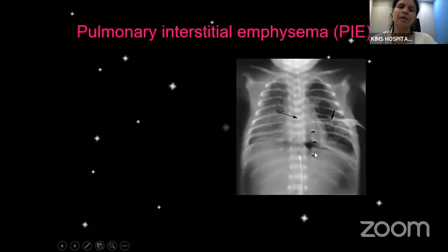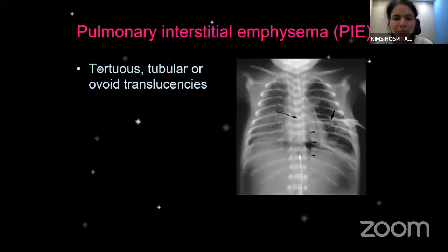We may also sometimes see pulmonary interstitial emphysema, which is the presence of air within the interstitial spaces in the lung, and also in the perivascular spaces. This may be identified as thin reticula of blackish lines, which may be interspersed in the pulmonary parenchyma, and we may also see it in the perivascular zone. So these tend to mimic air bronchograms, although they may extend right into the lateral third of the lung, and they do not follow the typical branching pattern of air bronchograms.